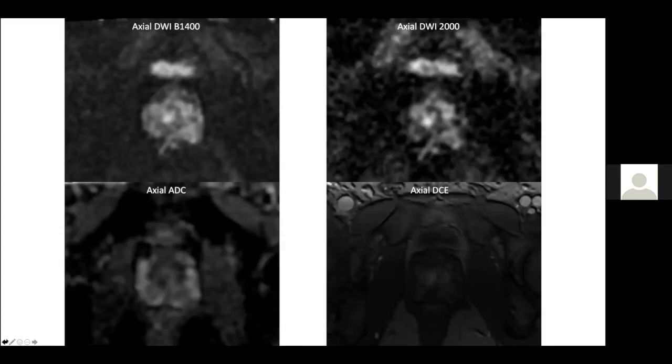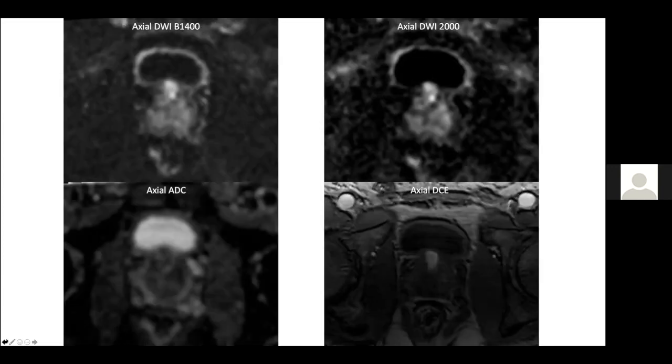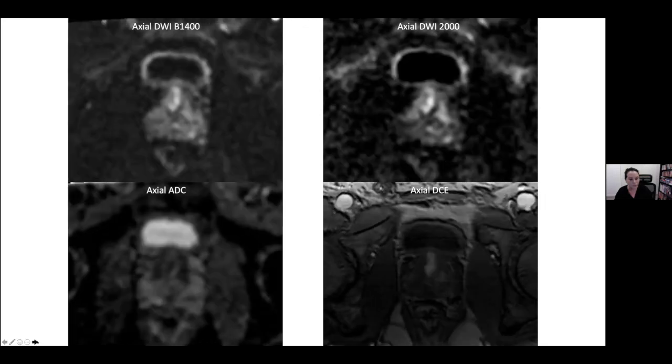And you find that there's often quite pronounced restricted diffusion in the median lobe. I think that's common. I agree. I was just wondering about the high b-values there in the mid prostate, whether they correspond, perhaps on that picture, to the contrast. I think contrast enhancement is very useful in the transition zone as well. Yes. It's not confined. It's best at the peripheral zone, but it's also useful in the transition zone.